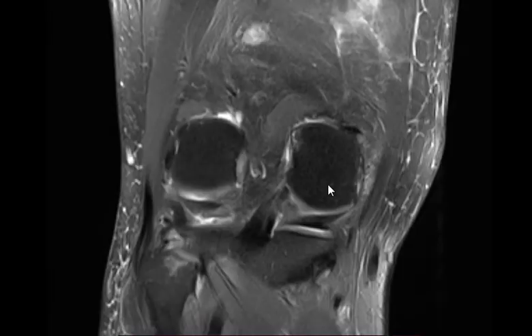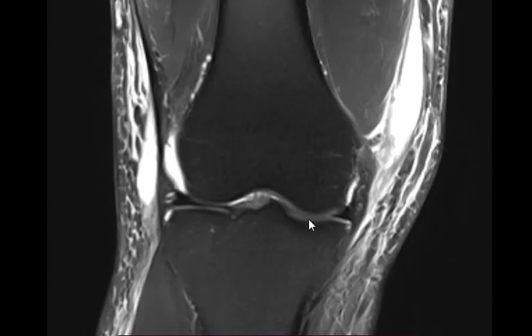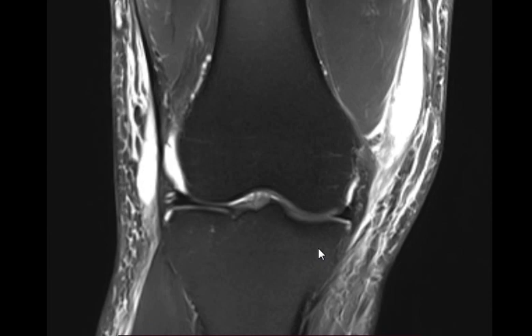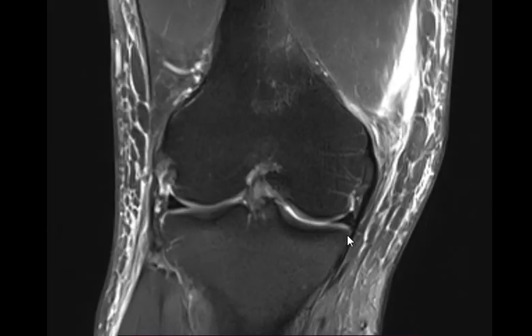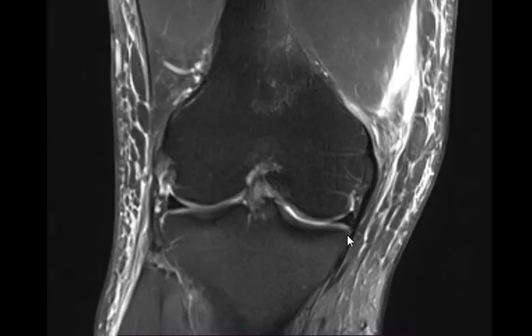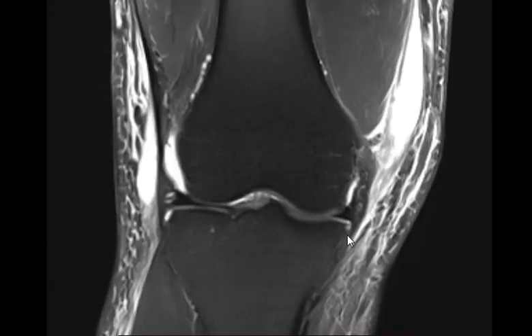And here we have coronal also proton density. Exactly. What's the main abnormality here? What catches your eye first? Loss of joint space. Really? Approximately. Okay. Take it easy. This is just a normal patient who came to the clinic with trauma and they want an MRI, nothing more or less. Nothing giant will come up. What's the main thing that catches your eye when you look at the image? Come on, this is a normal joint space.